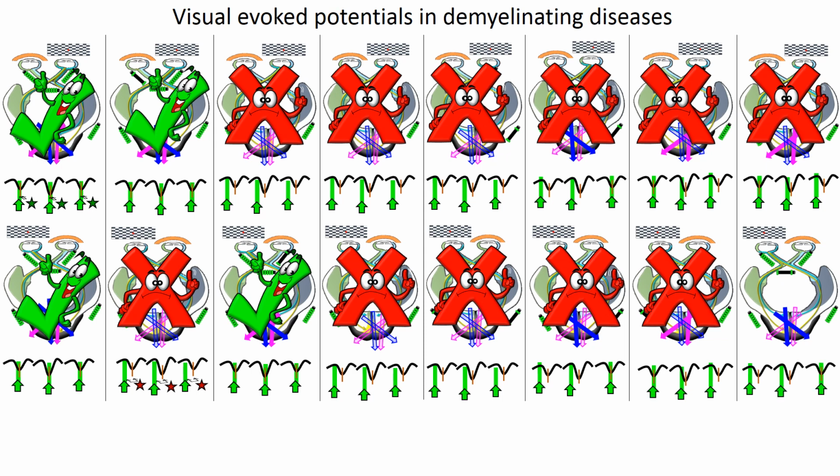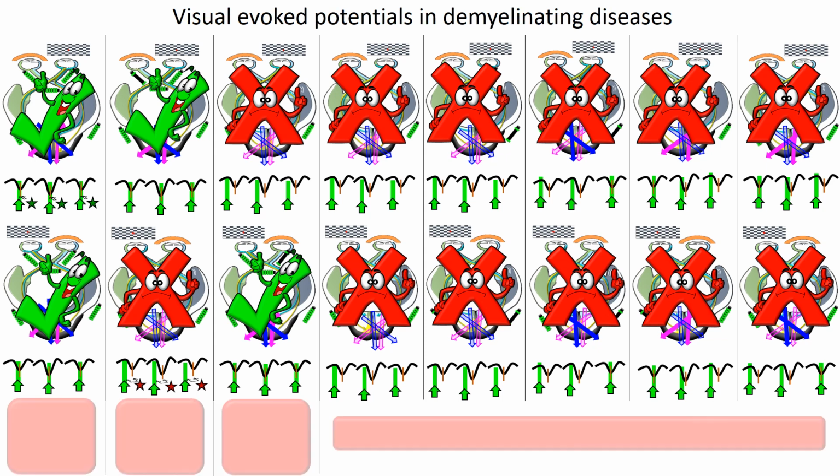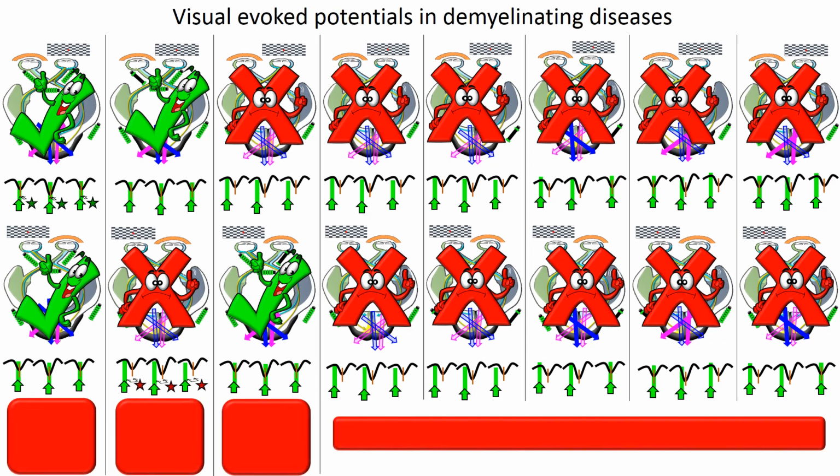The delay in the generation of these vectors arising from the right occipital lobe will produce a delay in the left parasagittal and sagittal P100, but the right parasagittal P100 will be normal. So the left eye testing will also be abnormal. Taking into consideration the state of the sagittal P100, we can only diagnose 4 conditions.